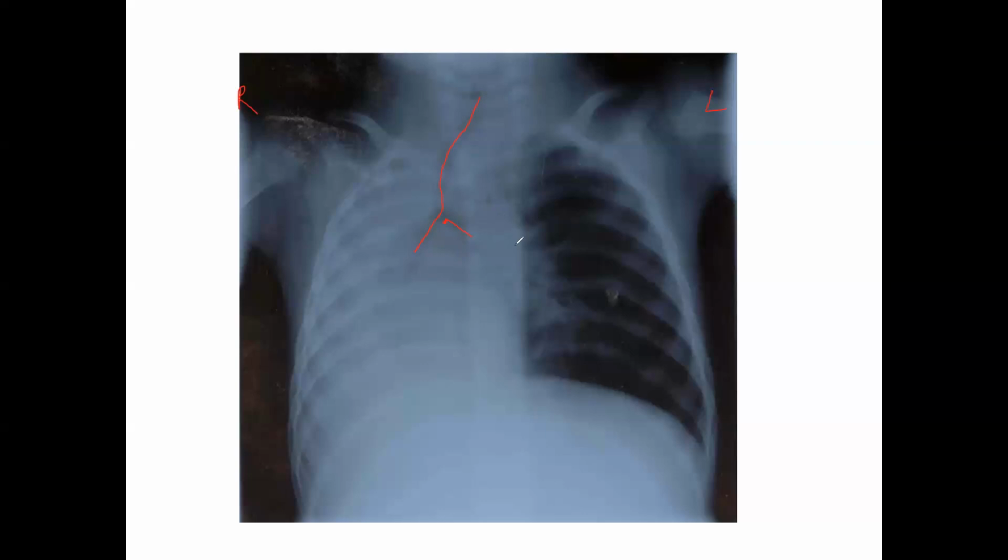So if you can remember, atelectasis, consolidation, pneumonia, and pathologies similar in nature to that are going to cause a mediastinal and tracheal shift toward the affected side, toward the disease, toward the pathology, as opposed to a pneumothorax, hydrothorax, chylothorax, pleural effusion, tumors, or anything to that effect, which would cause the trachea to move away from the affected side.